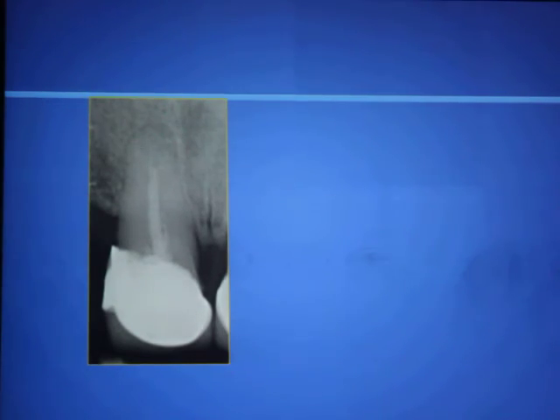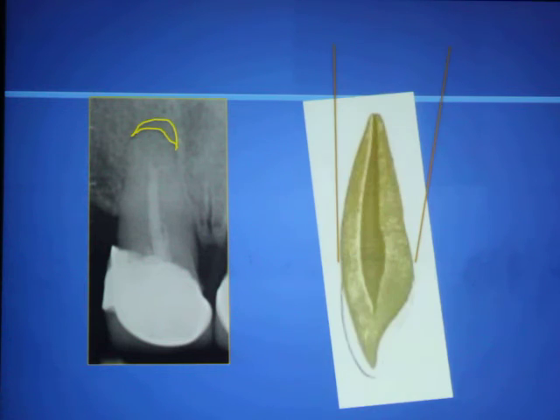So if we see a radiograph like this and we see a small periapical bone loss on a radiograph, which is a two-dimensionally compressed image of a three-dimensional tissue, thì trên cái phim X-quang hai chiều này chúng ta có thể nhìn thấy cái tổn thương như thế này. We actually do not know what is the actual size of the bone loss, how much the bone is lost.